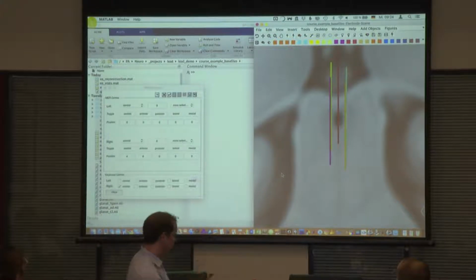So if we move this, then we see we are at this point. Then if we just press space, it will create a bubble at this point.